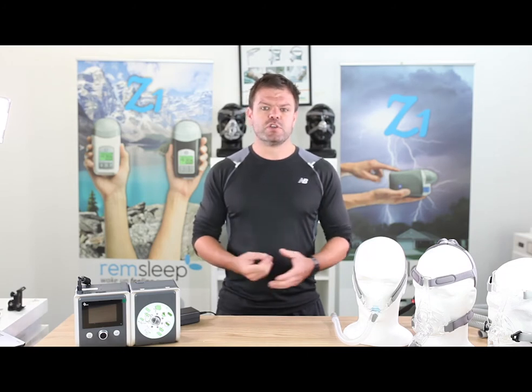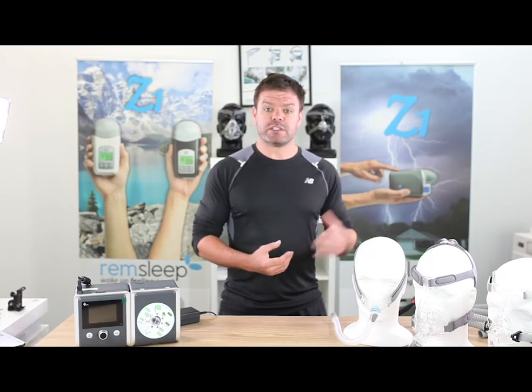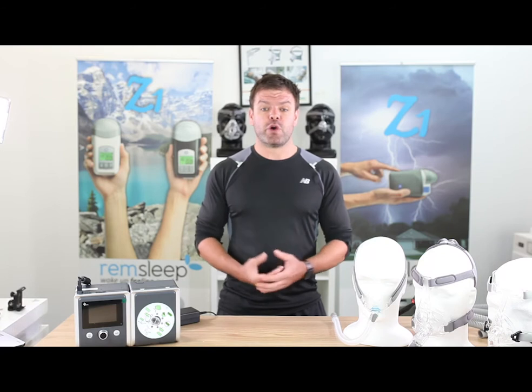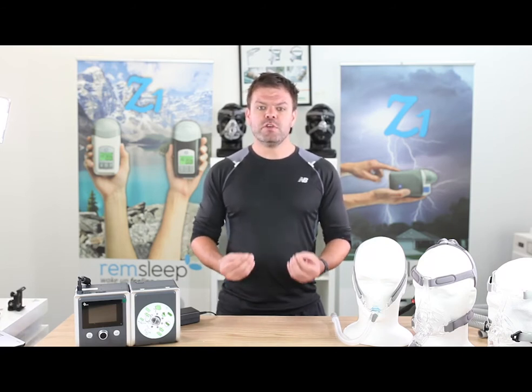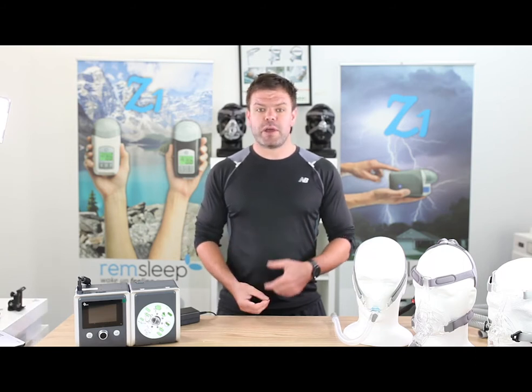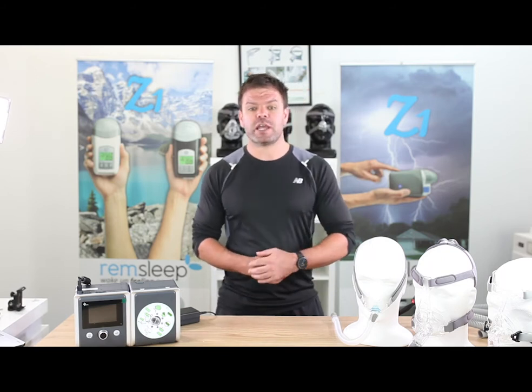So what's it actually used for? Well, number one is peace of mind. It's good to see from the data that you're getting a good night's sleep and that your sleep apnea and snoring is being well controlled by the machine. Secondly, we can use this therapy data to fine-tune our clinical settings to make the therapy more comfortable and more effective. And I'll show you a good example of that in a minute.